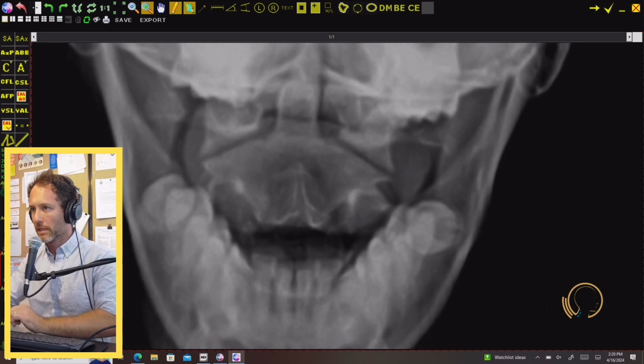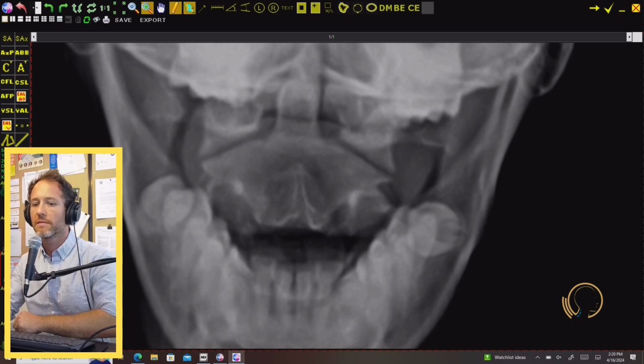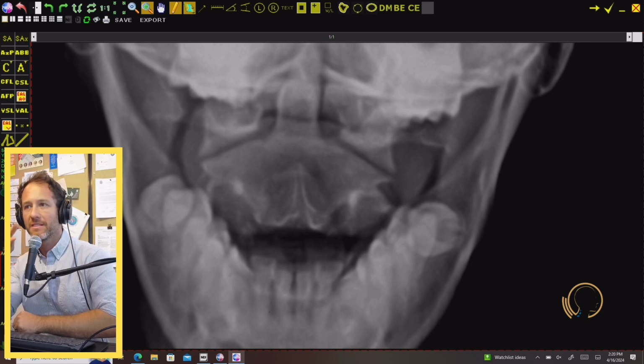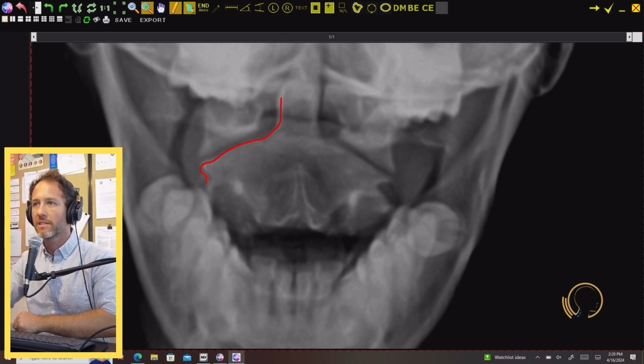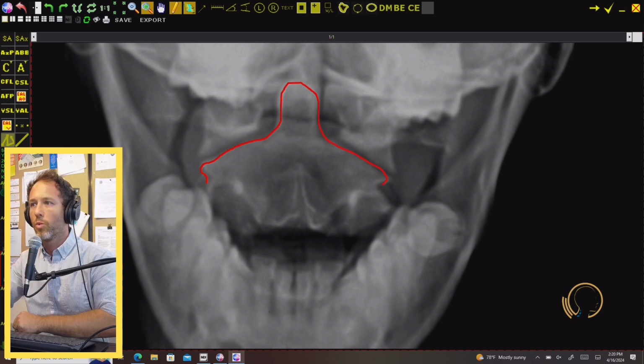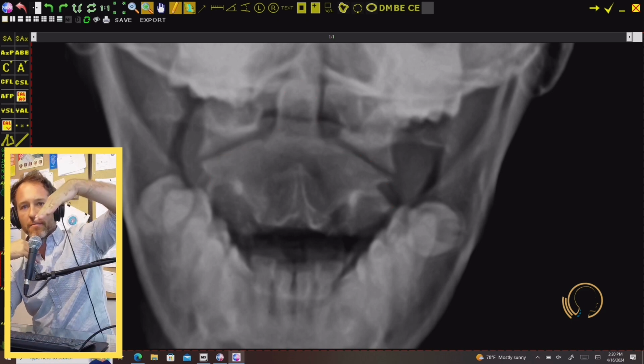But here's where it gets interesting. Okay? So let's say she's 4.25. Or like I said, I think I already measured her at 4.5 without the dots the other day. But in our seminars, in the boot camp, if you come to the boot camp, which you should come to a boot camp, plug. One of the slides that I'll never forget is where you have this C2 body shape. They carved out a few different x-rays, this C2. And you watch how this C2 shape evolves with different S lines that you took it at.